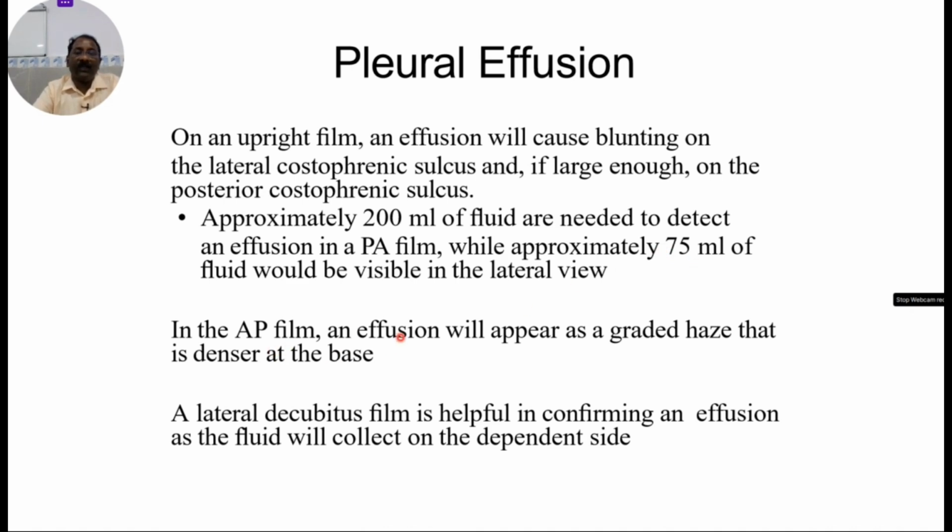In the AP film, the effusion will appear as a graded haze that is denser at the base. A lateral decubitus film is helpful in confirming an effusion as the fluid will collect on the dependent side.